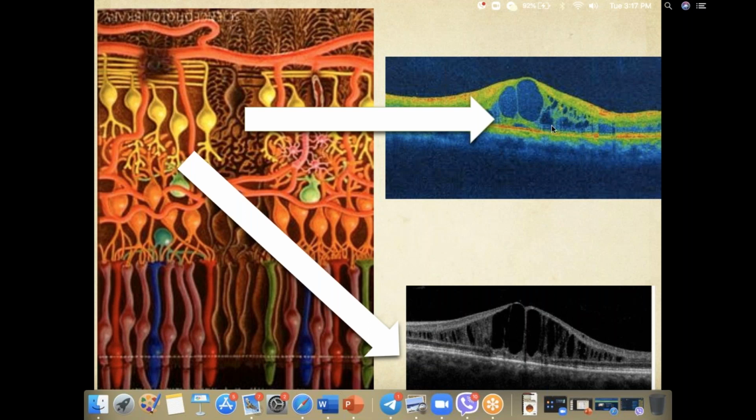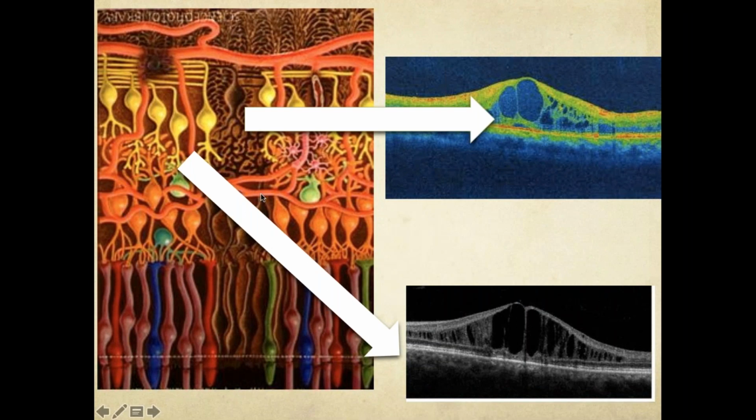Cystoid spaces start developing. And if you look at it properly, the cystoid spaces are spreading more in a radial pattern. So when the cystoid space is there, this is usually a vertical split, where the edema slowly starts splitting the plexiform layer. While if horizontal splits start occurring, as you can see in this image, it causes schisis. So this is a schitic retina.